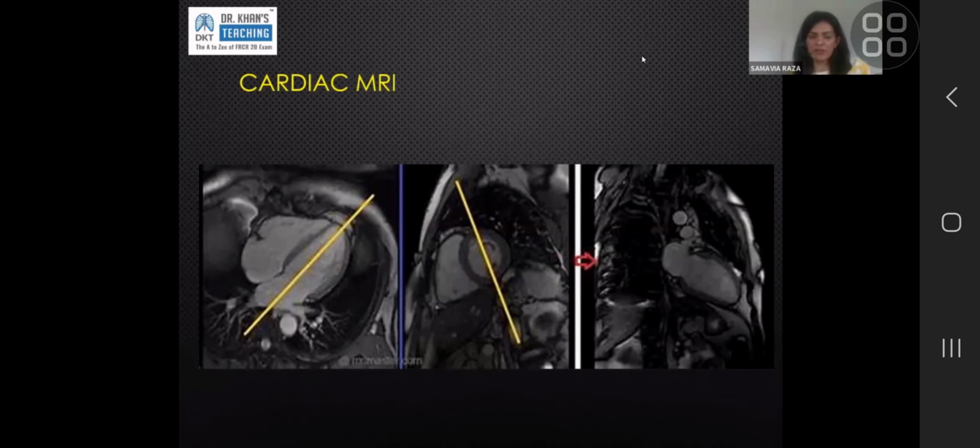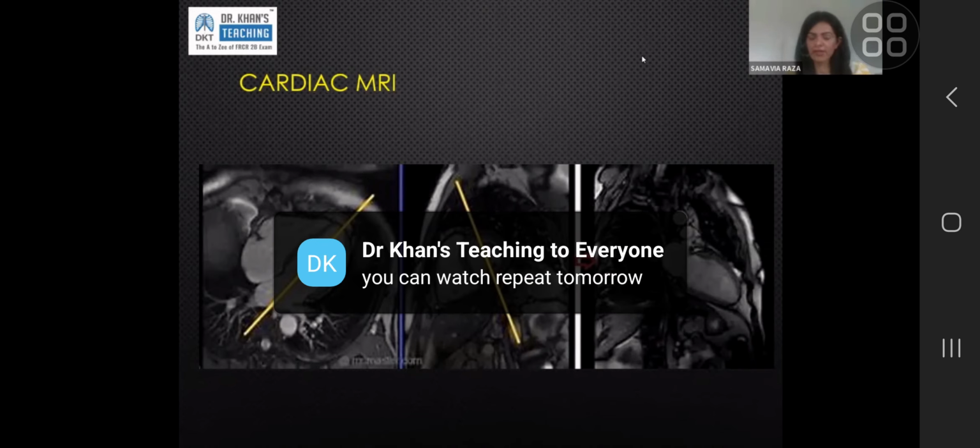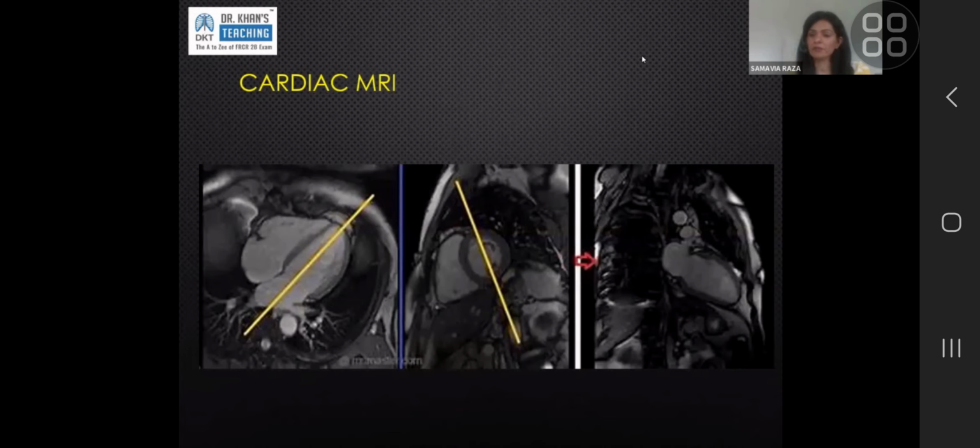The values we use in cardiac MR for normal are the values we use for echo. There are no validated values purely of cardiac MR. There is a lot of research data, a lot of different avenues being explored at the moment internationally. None of it is as heavily accepted. Still, echo values are still used for every scan we report across the world.